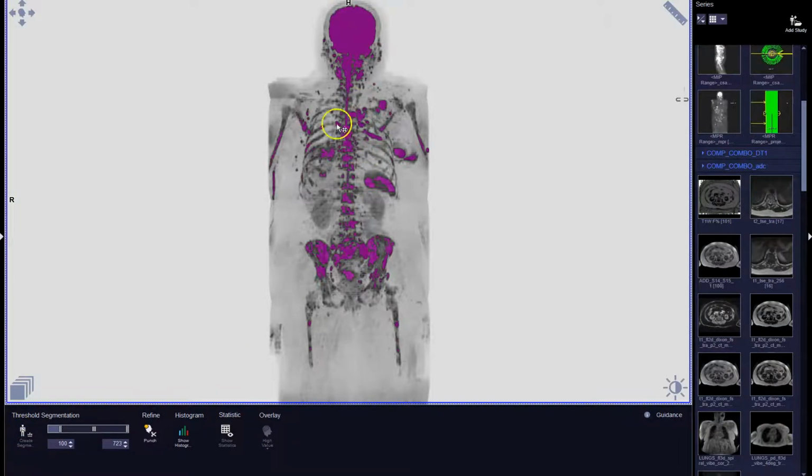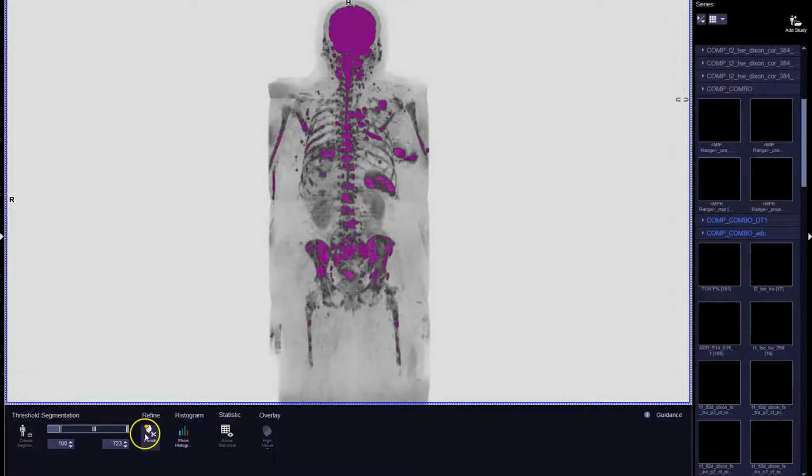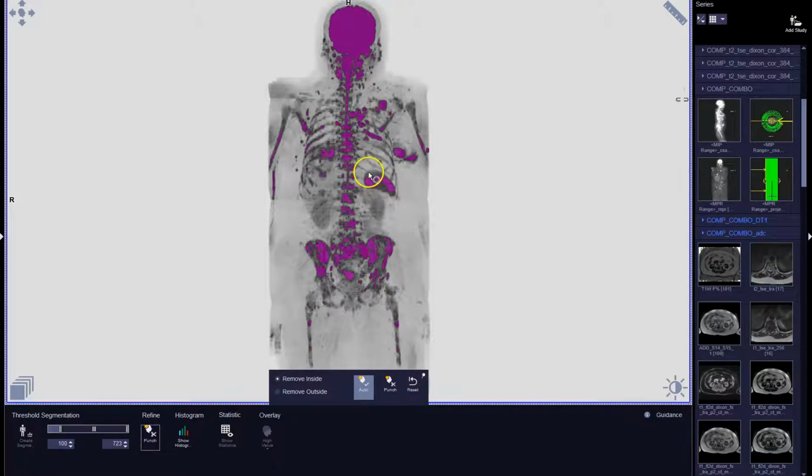Now you'll notice that the signal intensity has gone down, so there is less included bone marrow. So we're going to have to include a little bit more bone marrow in a second. But again, remove the spleen. We've got a liver metastasis here, which we need to remove. Remove the head. And remember to remove the uterus and ovarian structures. And here we've got a stasis in a vein, which we can also remove.